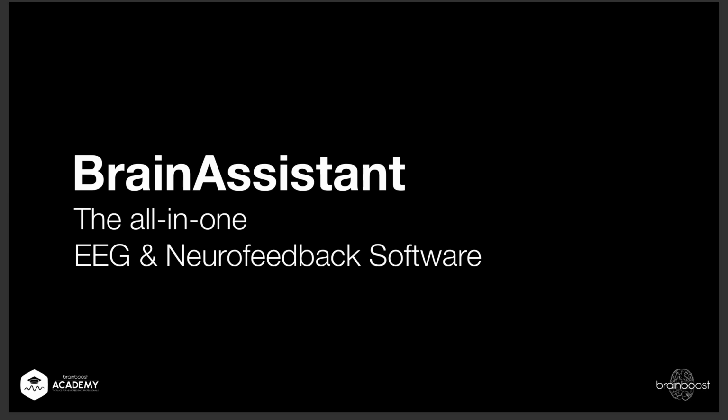In this webinar, I will show you the new Studio dashboard. The Studio dashboard will give you a first glance right after an EEG recording. It will show you different topics like cognition, focus, calmness, creativity, etc. You will have a first idea how the EEG recording can be interpreted. Also, it will give you certain recommendations of training protocols you could start with. Have fun with it. Okay, so let's get started.